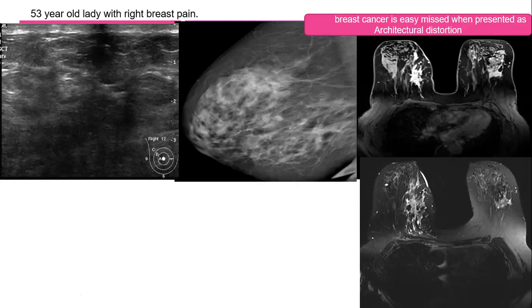microinvasion. We also raised suspicion for the contralateral breast based on the MRI, while the ultrasound and the mammography were occult. At that moment there was nothing on the conventional images to be biopsied, but based on the mammography and MRI, retrospectively, they tried to take a biopsy.